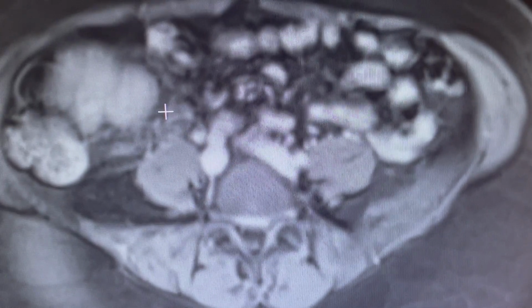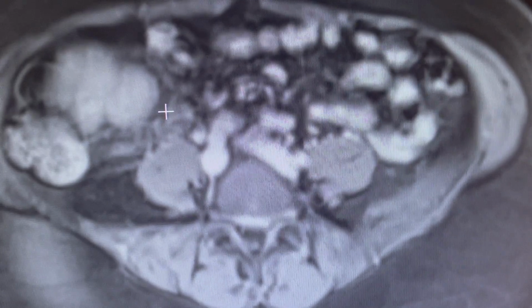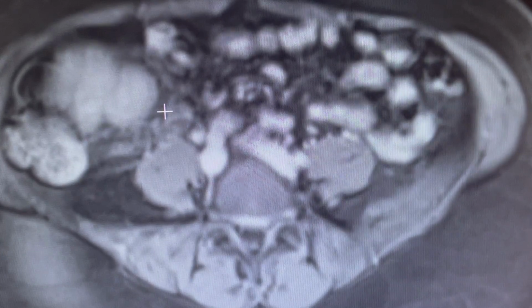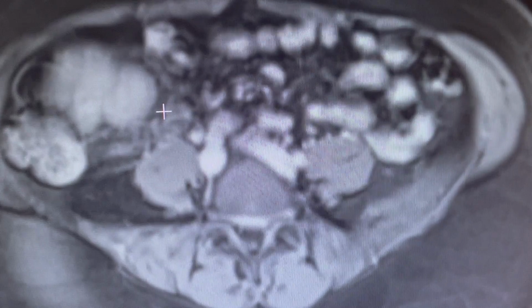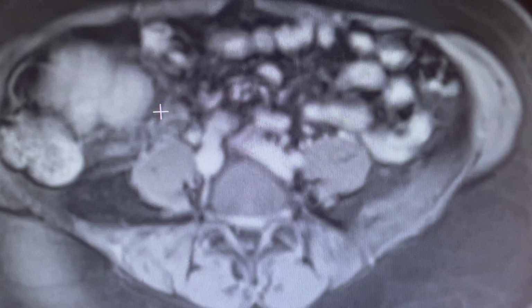There's limited ways that the liver can respond to inflammation, which, in my opinion, reflect the liver response to pan-splanchnic inflammatory changes, that it has developed benign liver lesions.